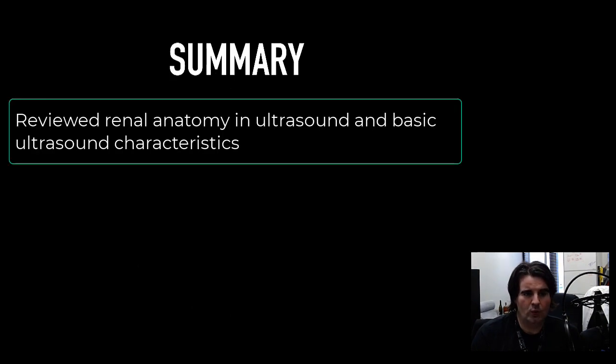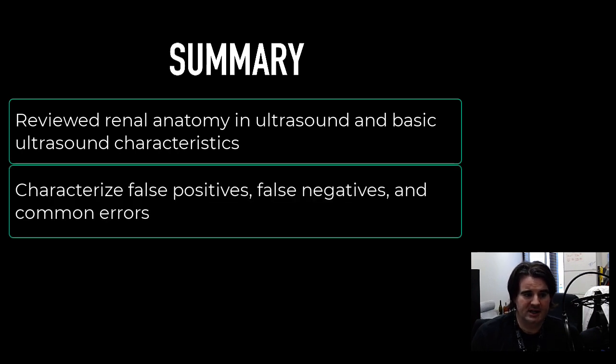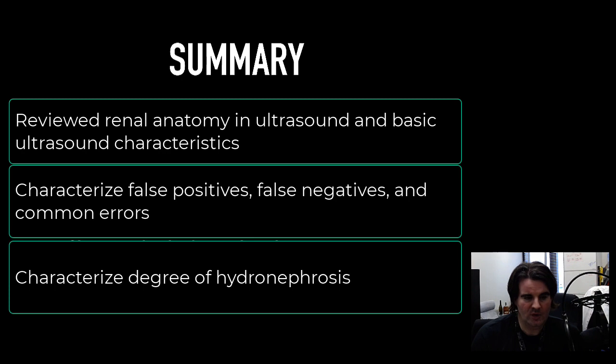To summarize, we reviewed ultrasound to describe the appearance of the kidneys in both health and obstructive disease states, and looked at findings that may confound your assessment of obstructive hydronephrosis. We talked about the grading system and using the mild, moderate to severe scale. I just want to note here that we did not do an extensive review of false positives, so there are other possible causes that can be considered, for example, parapelvic cysts. And also we did not cover renal stones, which can complicate renal obstruction and may demand more urgent intervention. That often requires more comprehensive imaging, plus or minus CT-based stone protocols for imaging of renal stones.